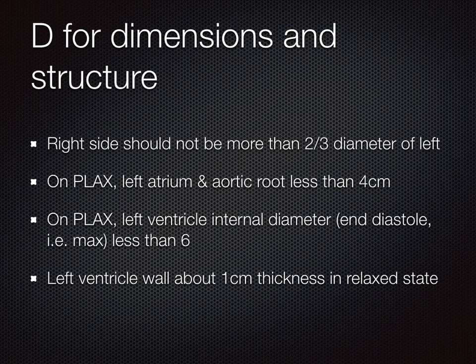So for instance, from the podcast, remember we said that if the right side was grossly dilated, it may be an indicator of a massive pulmonary embolus, and this is something that you might want to treat in an emergency situation. Also, being able to look at the normal chamber sizes is quite helpful.